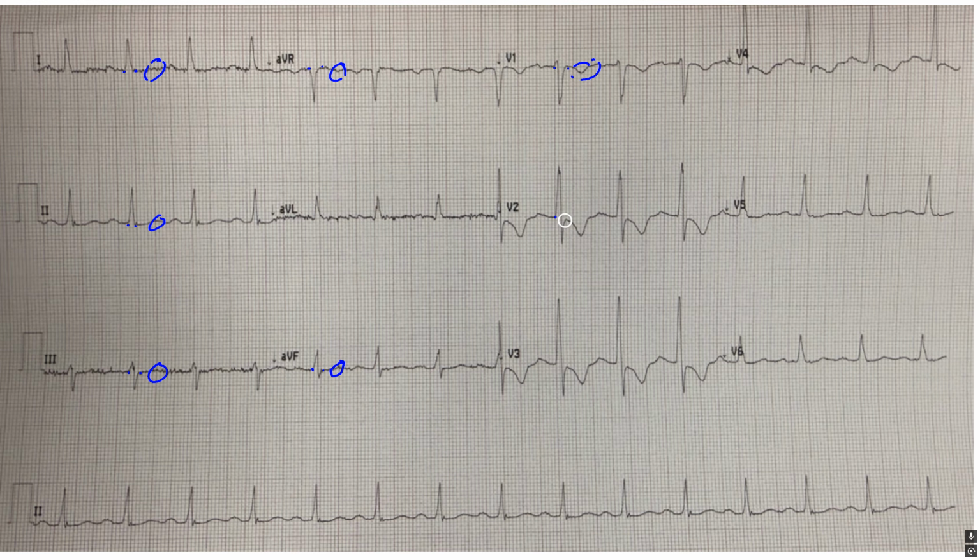Here we go. We got 1 millimeter of J-point depression here in V2 with this inverted T wave, which in the setting of a complete right bundle branch block can be normal. Here we have a right bundle branch block with this T wave inversion and slight ST depression. Here we have J-point deviation and T wave inversion. No significant J-point deviation. No significant J-point deviation. All right. So he's like, what's the most likely diagnosis? This, in and of itself, doesn't really tell me anything.